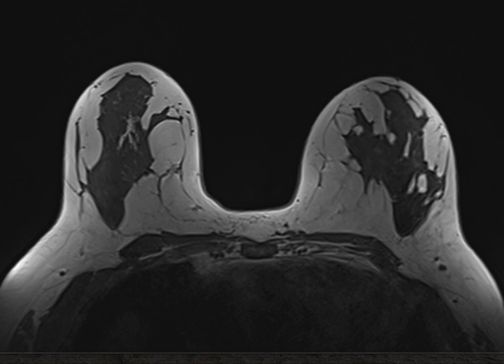So I am going to go through how to read an MRI. First, I will not look at the history, though you can look at the history if you want to. It's up to you. This is just the way I do it. The main thing is to go in order and stick with that order, and do the same thing all the time so that you don't miss something.